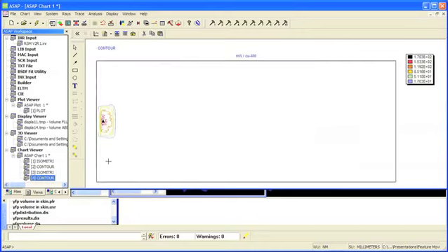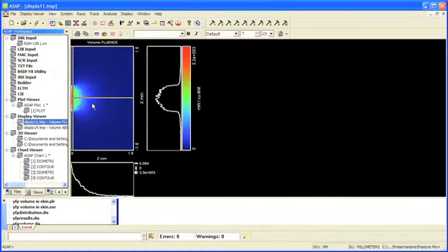And this is reflected in the contour plot. In fact, so much so that the energy that's absorbed within the dermis is beyond the bounds of our scale for this particular contour plot. Again, looking at the same information in a different manner, we can visualize the fluence in the skin in a pictorial representation and examine in the Z and X dimensions the fluence throughout the skin model.